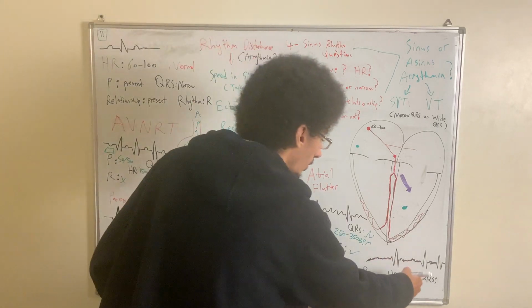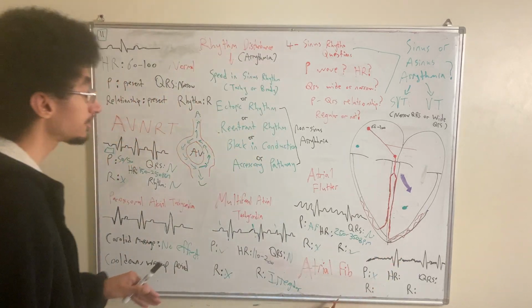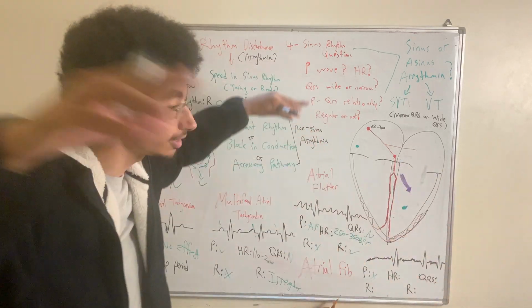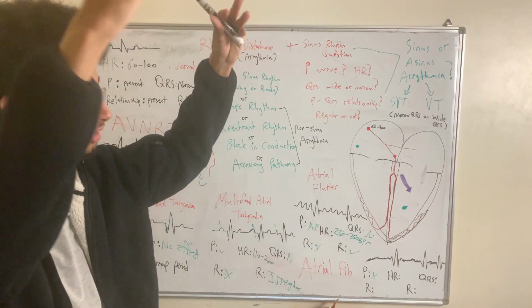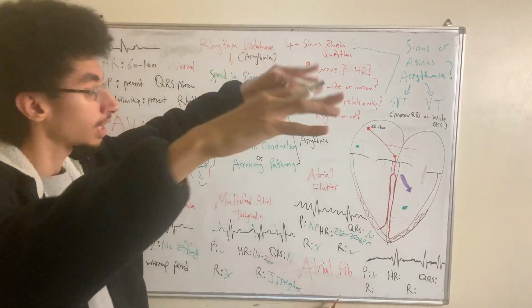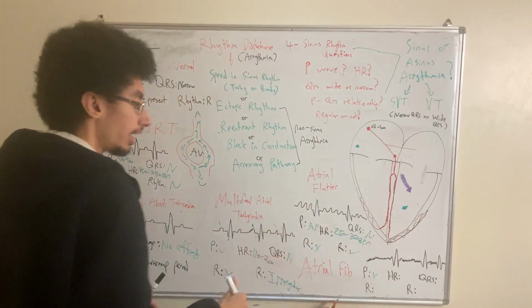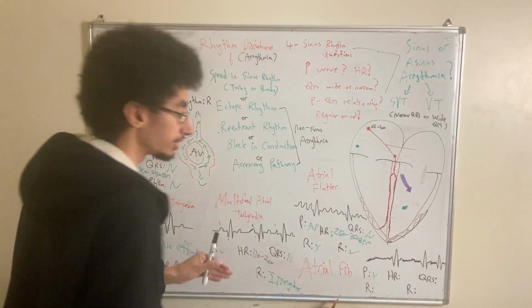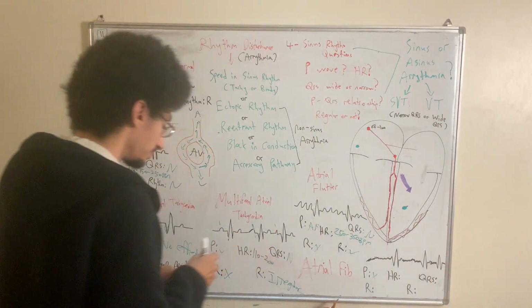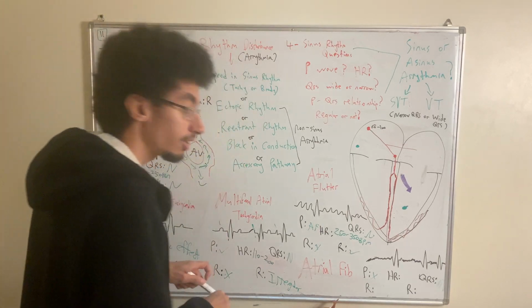The next is the QRS. The QRS is normal. And remember, the QRS is basically the AV node. It's telling it, I have a conduction delay. I will not accept all of these depolarizations, all this action potential. I will delay, choose one, and then move on. So the QRS complex is narrow and it occurs at its own rate. Regardless, the QRS is normal.